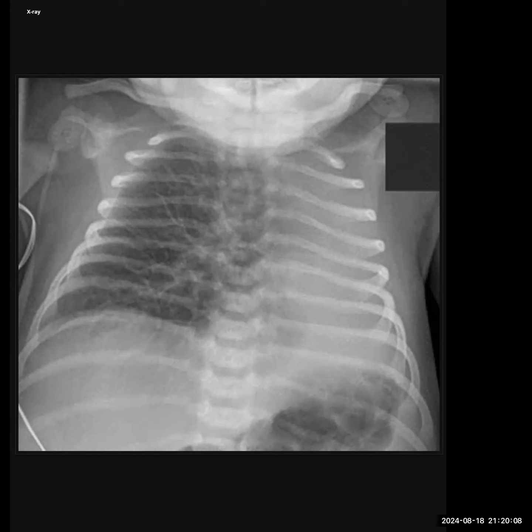Other than that, I'm trying to look at the diaphragm. I can't quite appreciate the diaphragm. I'm trying to trace whether this is a congenital diaphragmatic hernia. I can't see any obvious bowel loops within the chest. So this is not a congenital diaphragmatic hernia. So I would convey the findings and request a CECT chest in this patient.